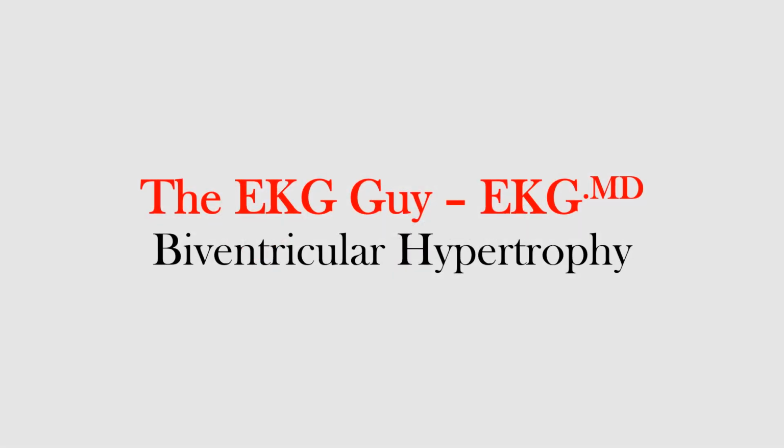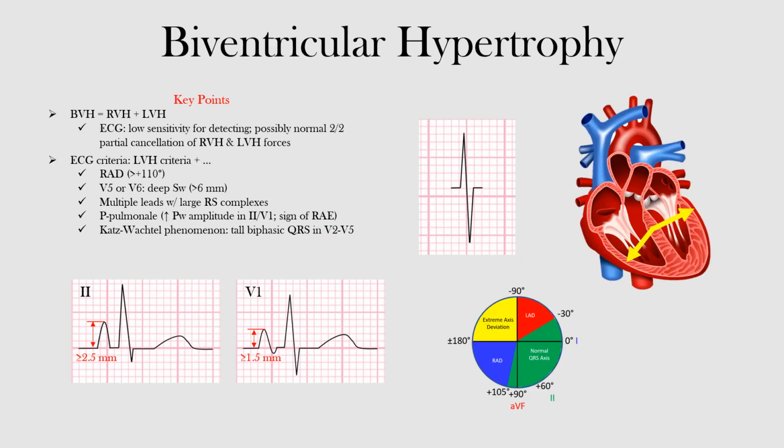In this lecture, we will discuss the EKG features of biventricular hypertrophy. Biventricular hypertrophy occurs when the right and left ventricles are simultaneously hypertrophied. Unfortunately, the EKG has a rather low sensitivity for detecting biventricular hypertrophy, which should make sense. There are strong opposite directed electrical forces from each ventricle that tend to cancel each other out.